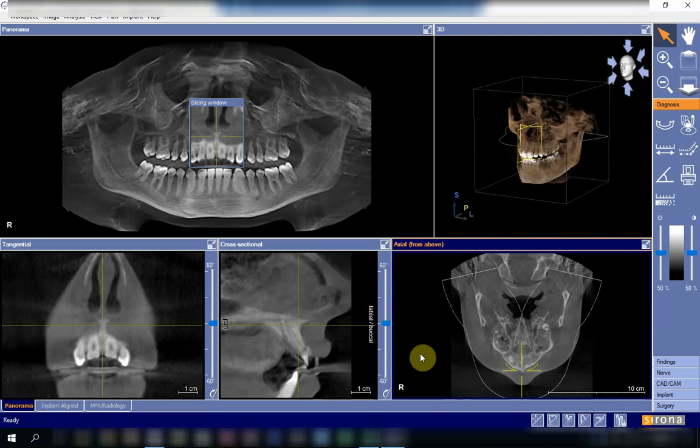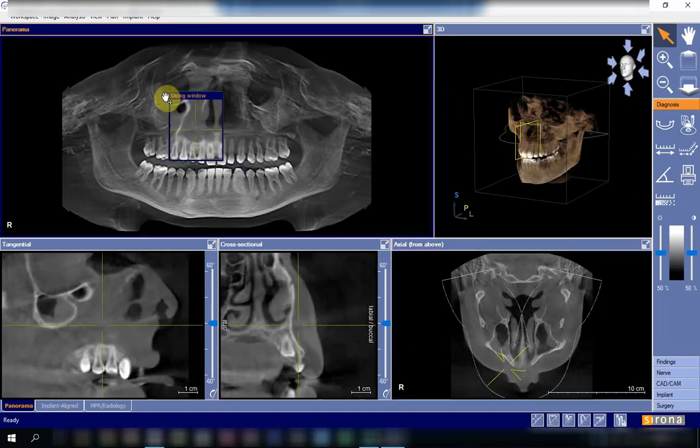As we all know, CBCT displays the hard structures, bone, and it does not have the ability to demonstrate the soft tissues in any part, except that we will see a gray appearance of the thick tissues, but without any clear demarcation of the type of that tissue.